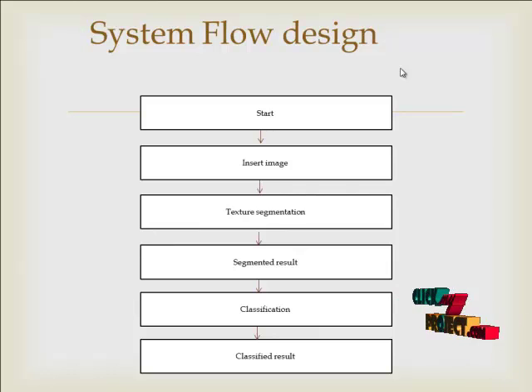By using the support vector machine, we are classifying the result. That means we are classifying the segmented image as malignancy or non-malignancy using the SVM classifier. Basically, the SVM classifier gives better results for biomedical images. So we can see our classification method here. We are replacing the existing one with our proposed SVM classification method.